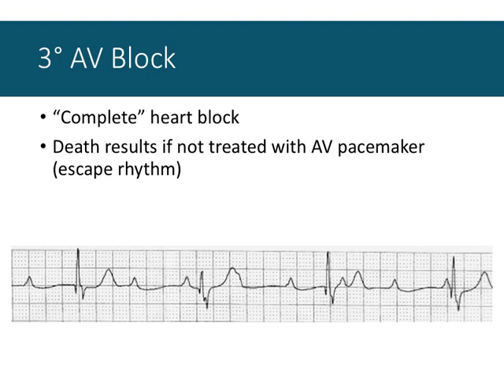Often you'll attempt to do this while the person exhibits second degree block before it deteriorates completely. And you can see here 2 separate rhythms. There's one rhythm initiated at the atria, a second rhythm initiated at the pacemaker in the AV node.